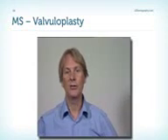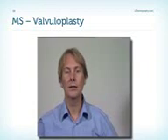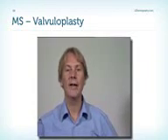Why? Because we want to exclude that it has a thrombus, and we want to look at the morphology once more, and also at the interatrial septum. And then we perform the procedure. Usually we do not need a transesophageal echo during the procedure, only in some patients where we believe that it might be more difficult. In most patients, we look at the echo right on the table.